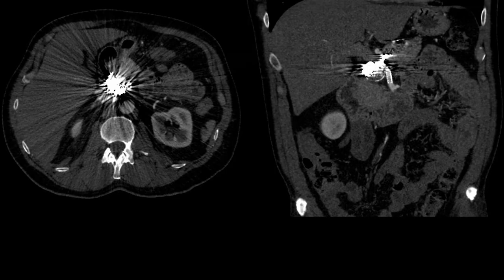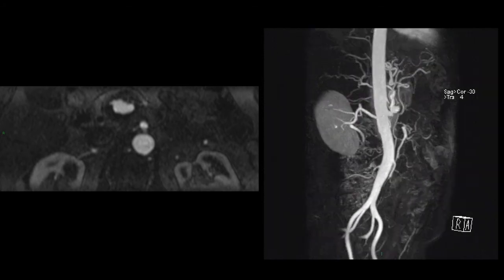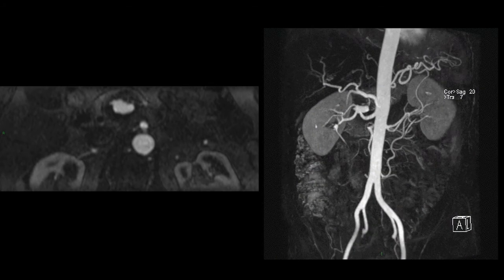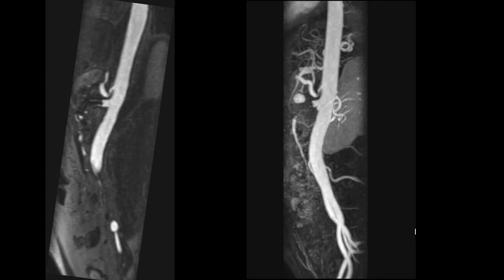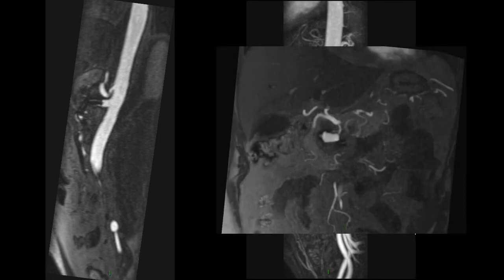She went for a follow-up CT to assess how well this went, and you're not really any clearer after the imaging's been performed. Nothing but streak artifact here, and you can't really see any detail of the aneurysm itself. So we performed an MR, which very clearly shows that there's still blood flowing into the center of this. Now, there is some signal dropout from where the stent was placed, and people often cite this as a reason why MR is not good for following up these sorts of cases. However, the MR didn't have any of the streak artifact of the CT, and very clearly shows the feeding vessel, which allows us to plan a second embolization procedure to completely close this off.